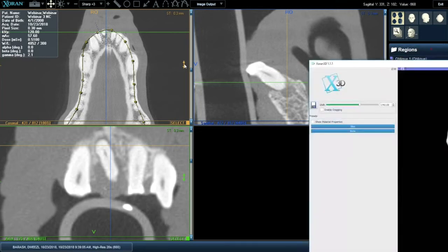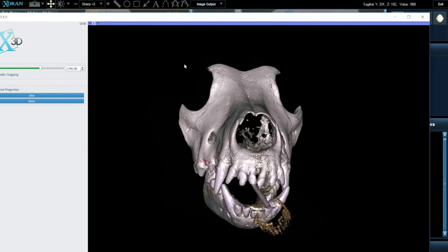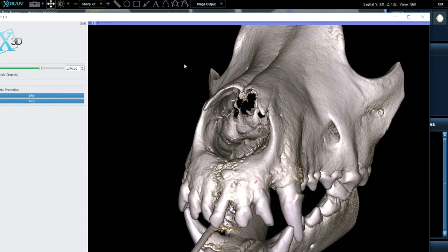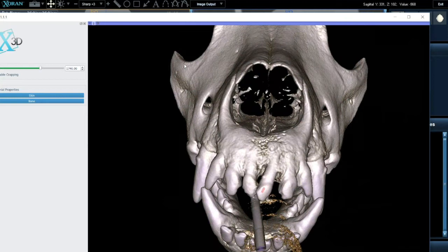If we have doubt and we're a bit lost in space initially, then we can certainly bring up the 3D, again being a little careful about what we actually see. But in 3D, we would in fact notice this significant amount of bone resorption in this one area. It becomes a bit more obvious in 3D. We also see that that tooth is displaced.